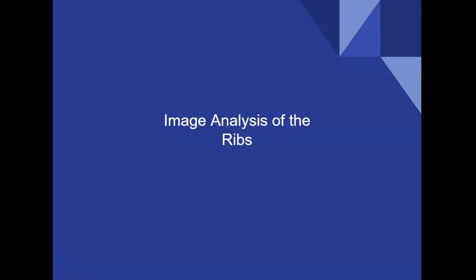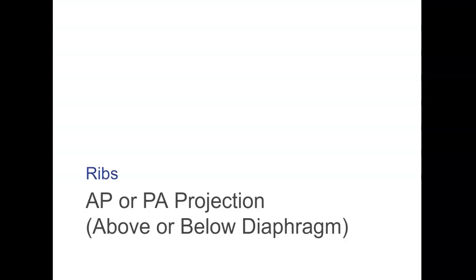This presentation will review the image analysis of the ribs. Let's start with our AP or PA projection.